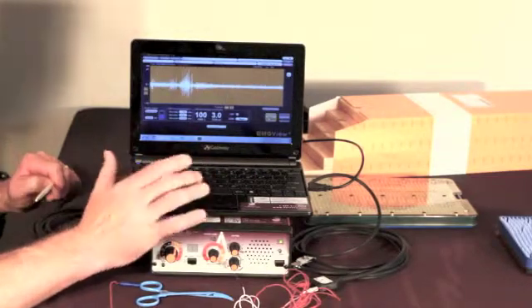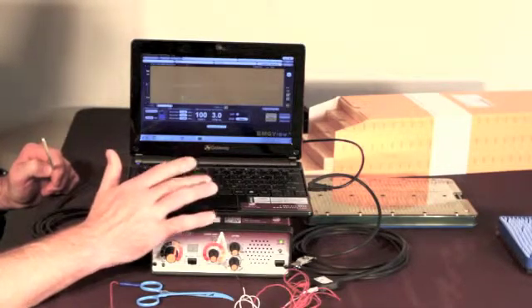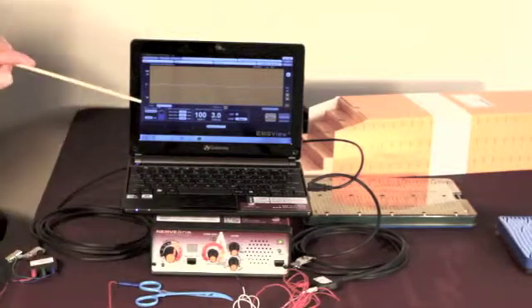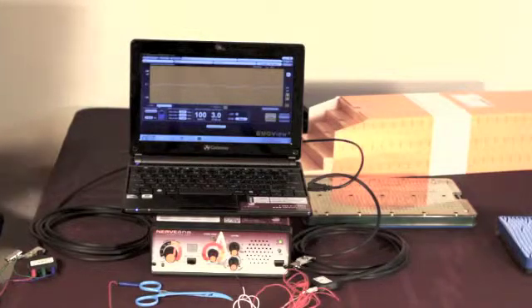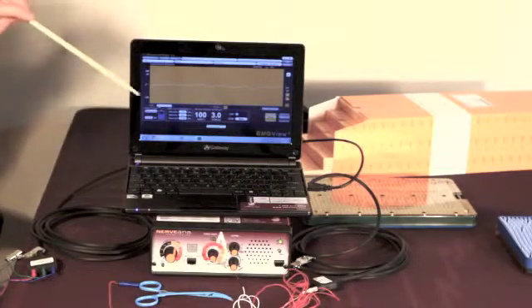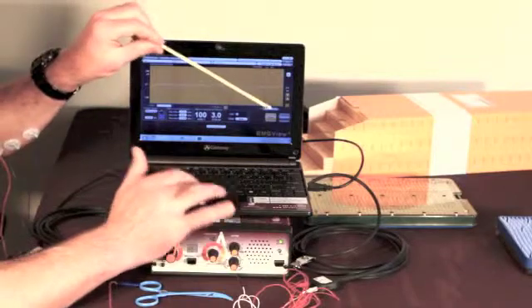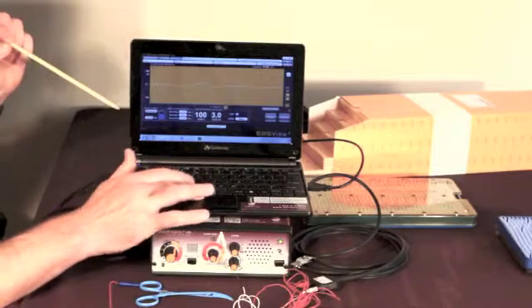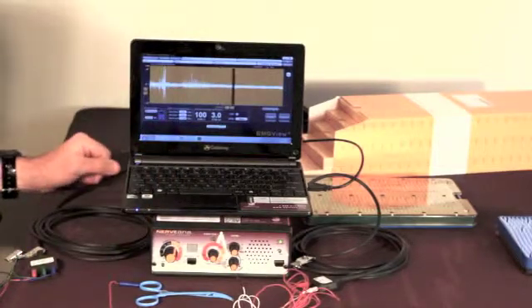You can see the screen stopped, and you can actually, by clicking to the evoked window here, you can even go back in time. You click on these little buttons here, so if you're away from the computer and something significant happens, you have up to 10 seconds to walk over, hit freeze, and back up using these numbers. I'm going to unfreeze now by clicking here, and as you can see, it's running again. And I'm going to go back to evoked and free run mode.